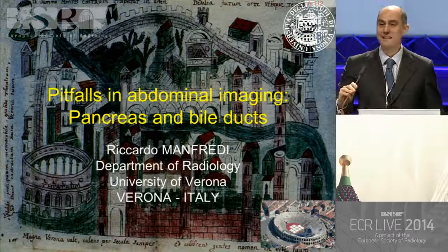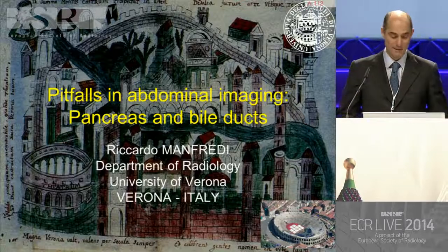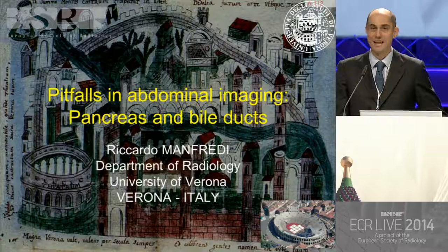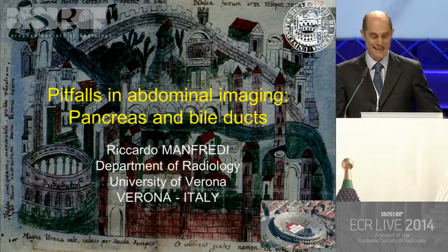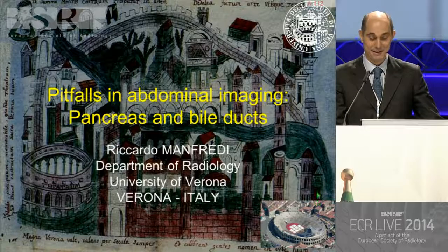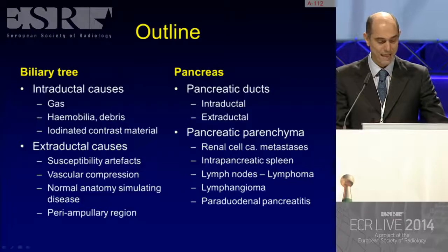Okay, so welcome again, and we move on to the pancreas, the pitfalls that may occur in the pancreas and in the biliary ducts. And I will need your help here because I have difficult cases that I would like to have your help on.